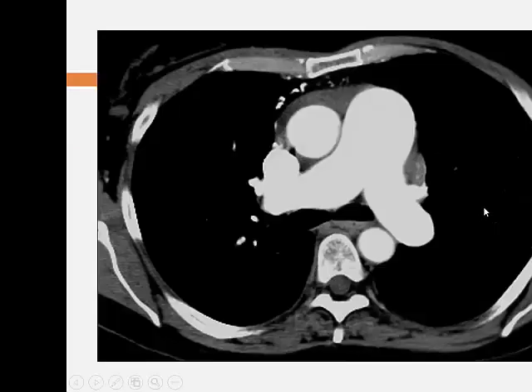Yeah. So again, here's an example, massive pulmonary artery clearly. Yeah. So if you see that, again, no PE, lungs look okay, just run through that checklist, ASD, anomalous venous drainage, if nothing else.